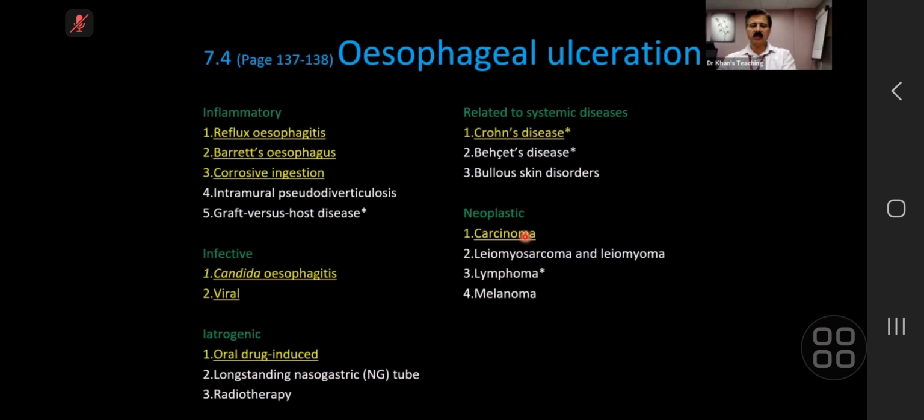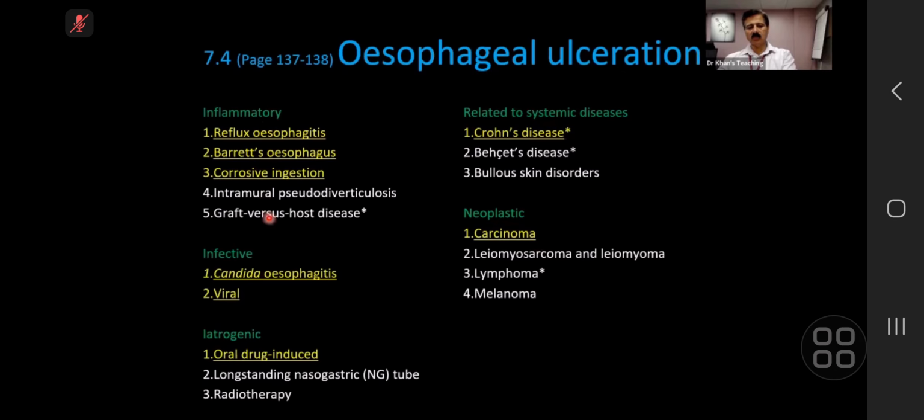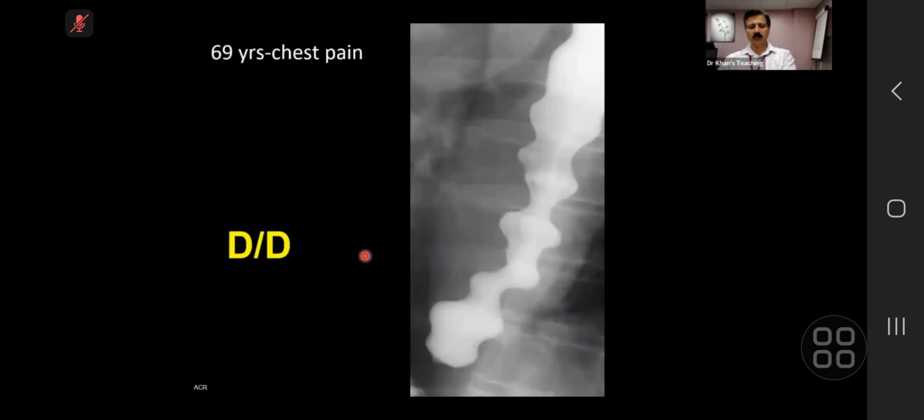And this is a differential diagnosis where it is a huge list of inflammatory, infective, etc. Because of time factor, I'm just skipping points, but I want you to develop your eyes on this. And once you pick it up, then the examiner is going to ask you the differential. And then this is the differential. So the idea was just to develop your eyes on this finding.